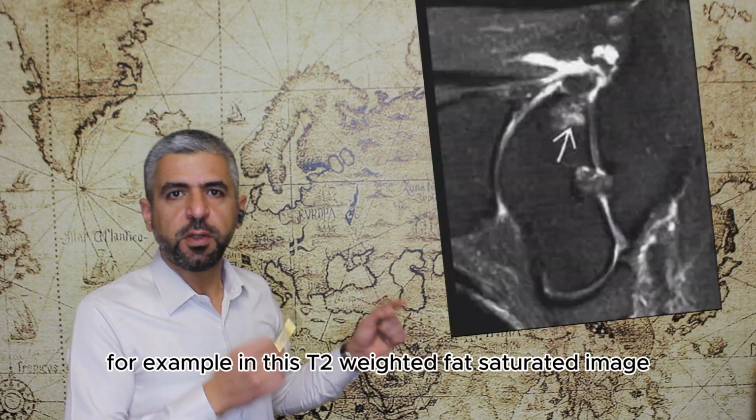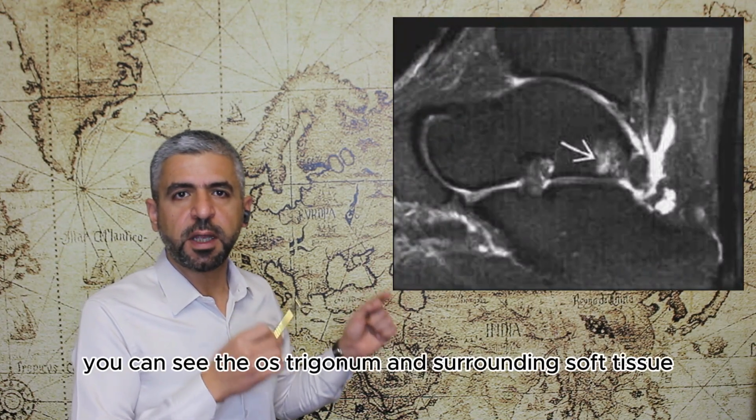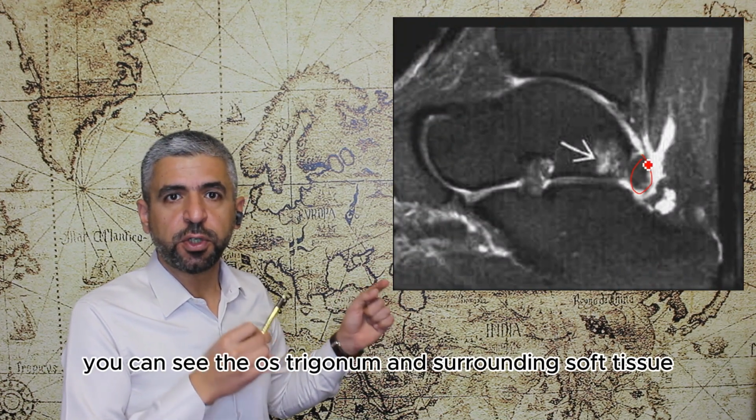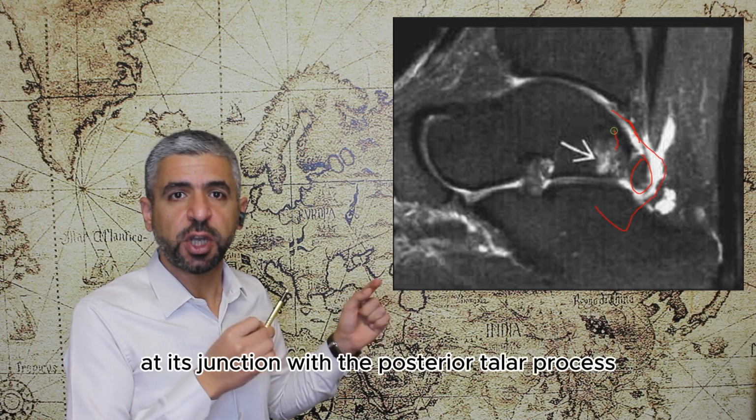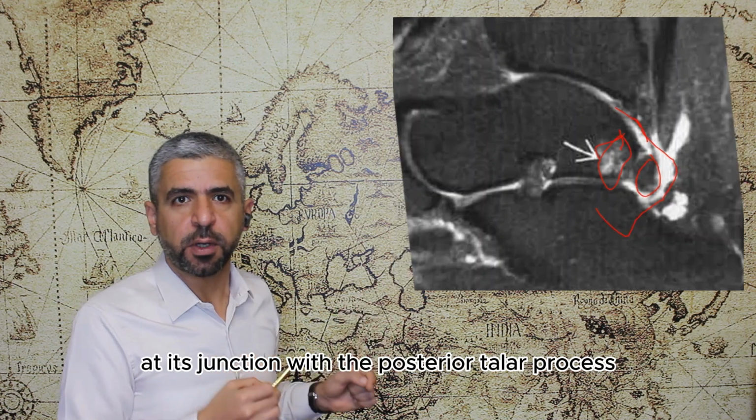For example, in this T2 weighted fat saturated image, you can see the os trigonum and surrounding soft tissue edema suggesting tenosynovitis with some bone marrow edema at its junction with the posterior talar process.